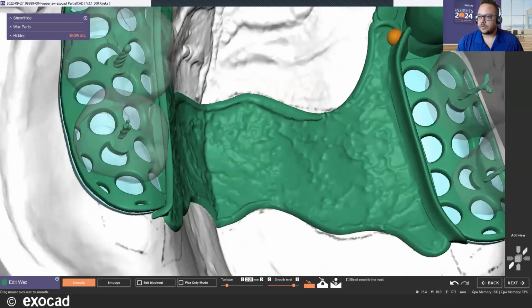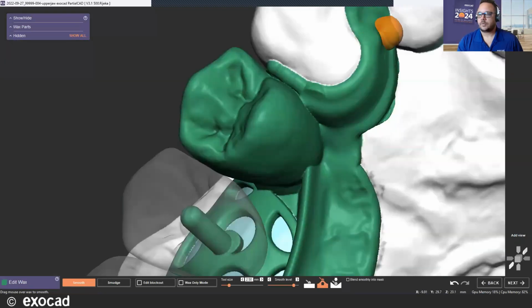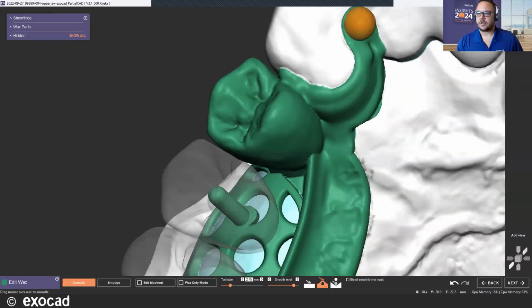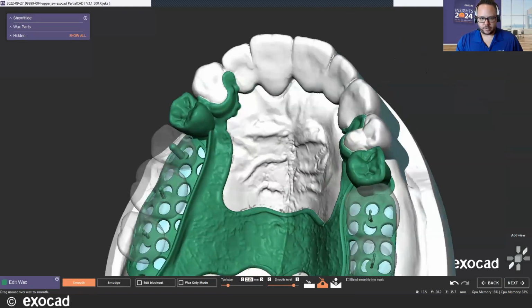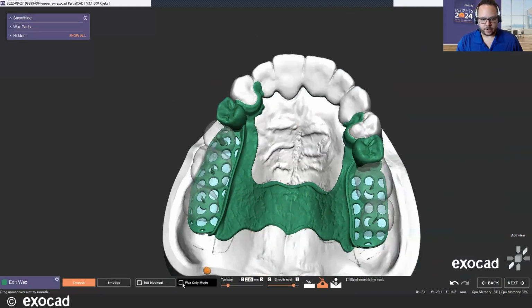And then from there, we'll go to the other quadrant. Go ahead and perform that same action. And today we're trying not to focus too much on older functionality, so I'm just blending it rather quickly. Okay. So the next thing, it's a pretty cool feature as well.